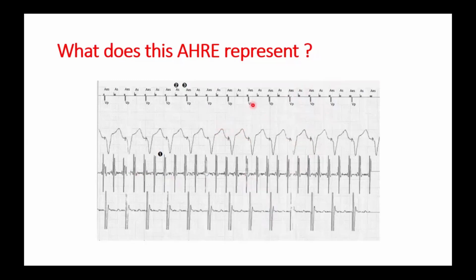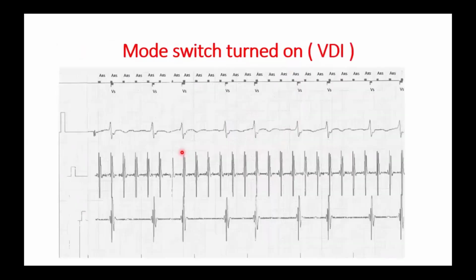In this case, the mode switch was intentionally turned off to record this tracing from the AV block, and then the mode switch is turned on.